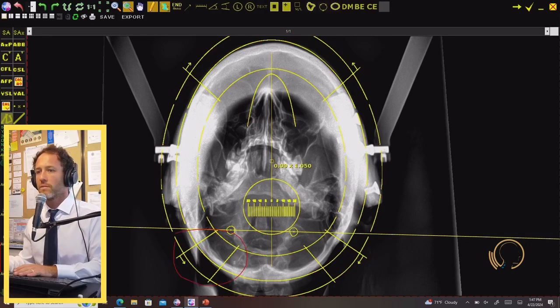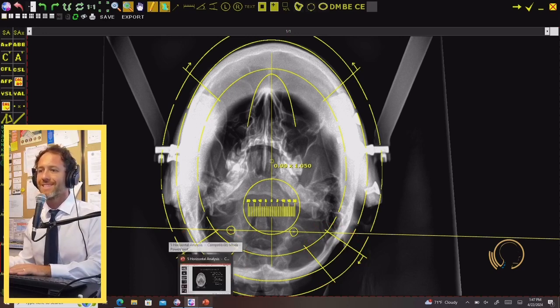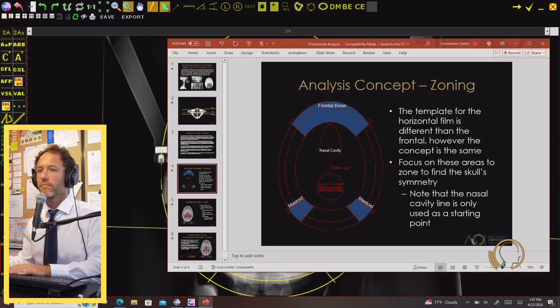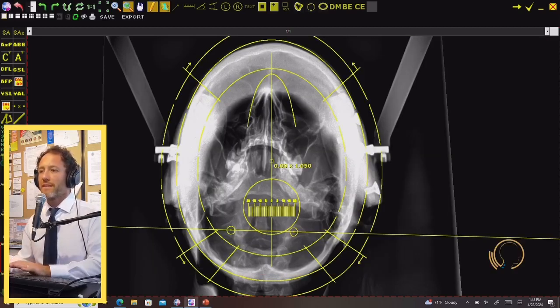These two windows, this one here, right? And this one here. And I'll go back to the slide because this is looking a little bit crazy. But the idea being that these three windows collectively will give you the most consistent sense of the skull. All right, so if you look here, you'll have that frontal bone, right? And then these two windows back here. And the idea is you want to have the same space.